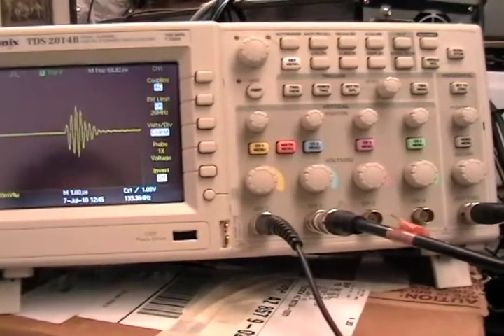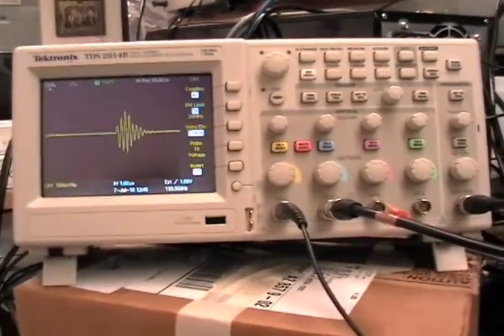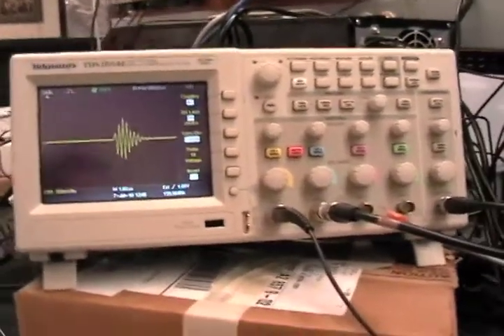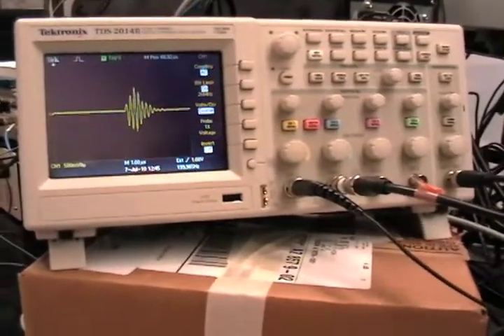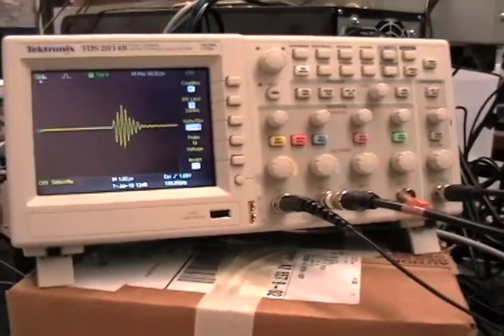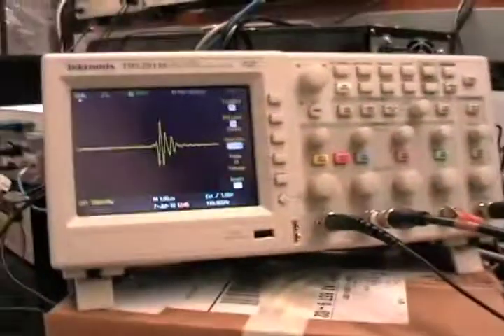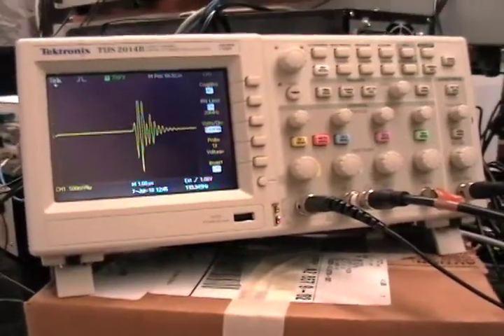The focal length of the transducer can be found by moving around this motorized stage. So this gives us, it's a pulse echo, so it shows us where the strongest signal is received. So when we move around the transducer using the motor, you can see that the signal increases, decreases depending on what's being reflected.